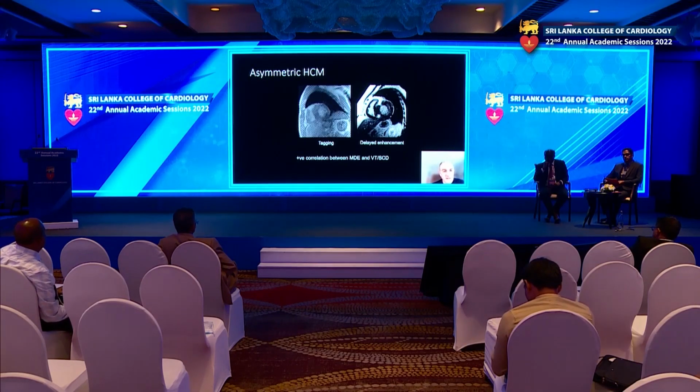Myocardial tagging is a sequence which I discussed earlier on briefly, and it shows grid lines across the myocardium, and you can see how they deform throughout the cardiac cycle. And what's interesting here, within this hypertrophic myocardium within the septum, you can see relatively little deformation of the grid line, showing that although the muscle is thickened there, it is not contracting in an appropriate way.